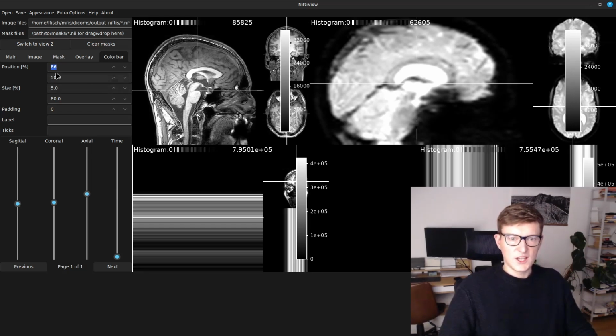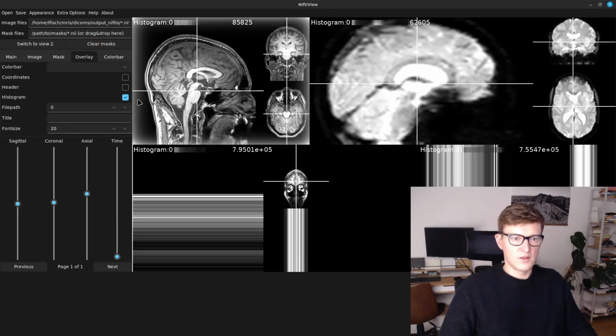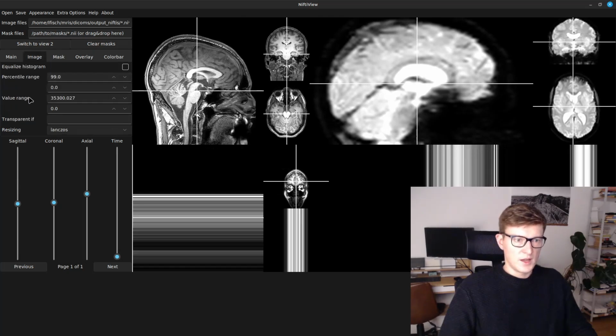And we can change that, and often clinicians do, to improve the contrast of the image by changing this value range. So a clinician would go in and change the lower intensity threshold and the upper one systematically to improve certain tissue contrasts.